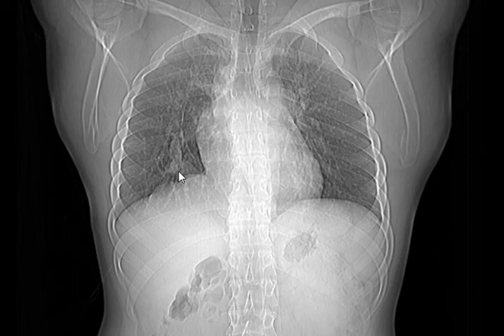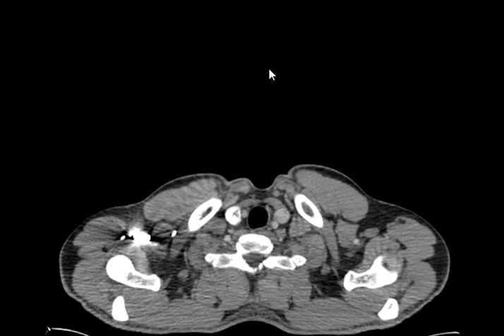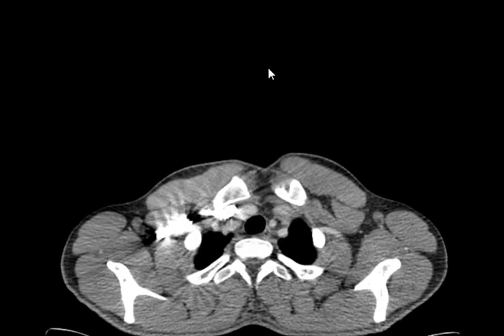So, what would you like to do further to see? CT angio. Give contrast. Make CT angio. Let's see if we have the contrast. This is the contrast image. Scroll. عندك الستيرن. Tell me what's going on.